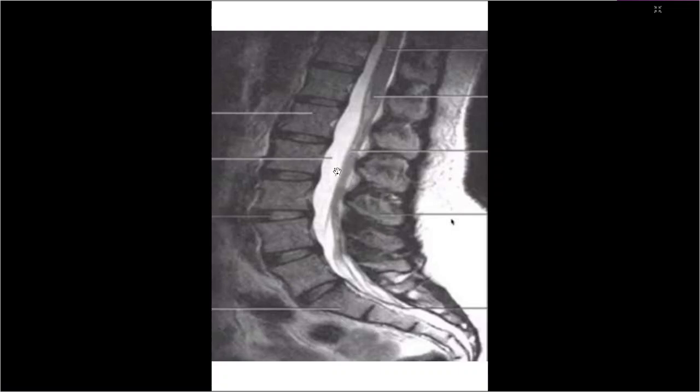Fusion and maybe slanted. Can you see? Yeah, slanted. This is the area where sloping begins. Can you see the sloping? Yes. Okay, so looking, no discs, they are fused and sloping begins here.